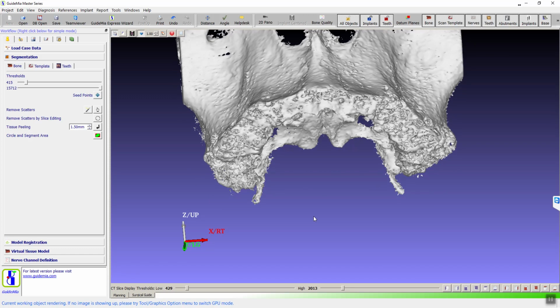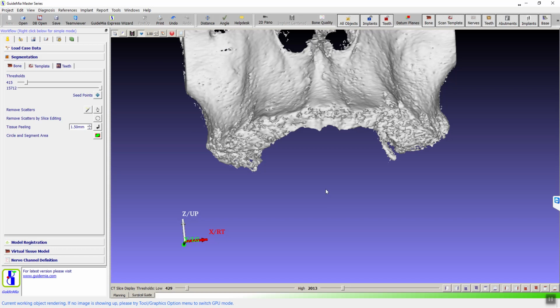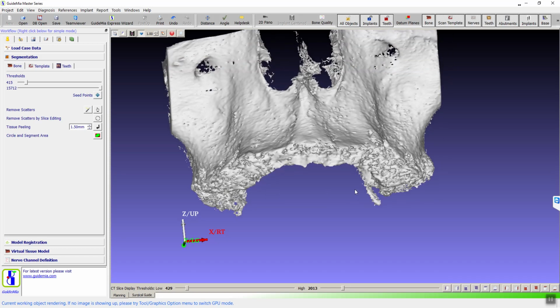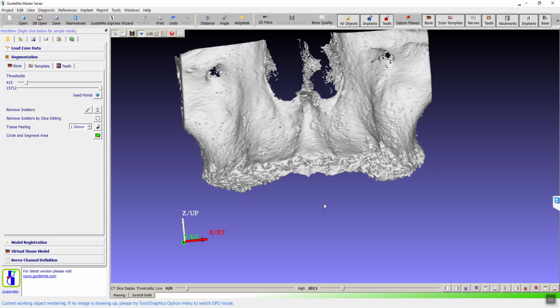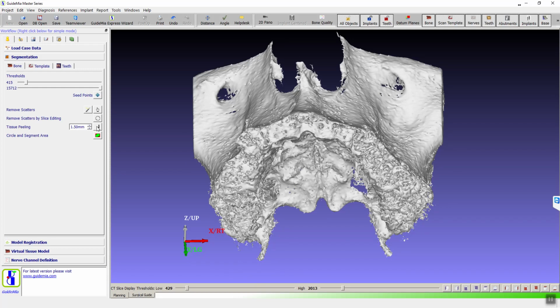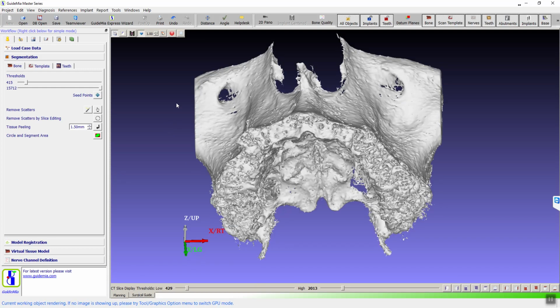What we are going to do is, instead of doing this filter, assume we are actually pinning the soft tissue, meaning we are not going to pick each of those little small holes. We will keep tissues inside those areas. So what we do is just one mouse button to do this operation.